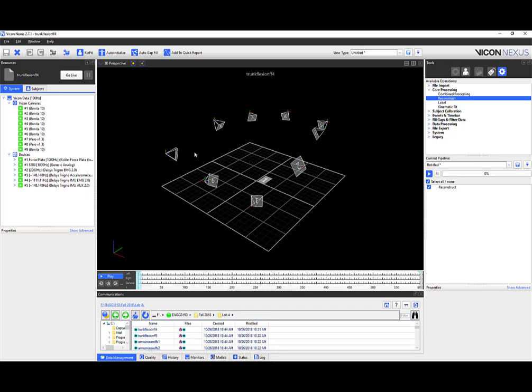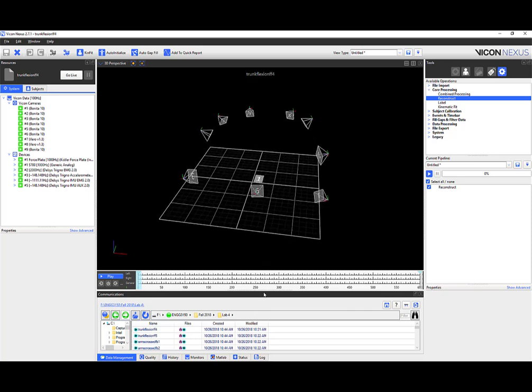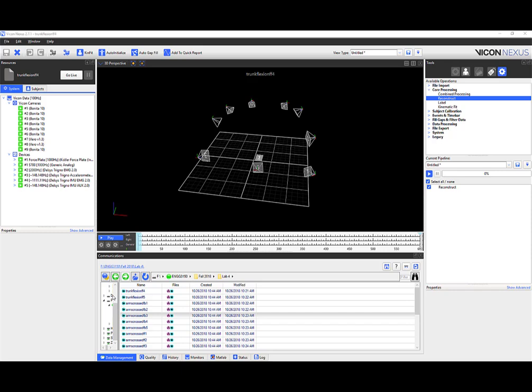So this will be a very casual recording. So I'm just going to be doing my thing here, and just outlining some tips and key points as we go through. So let's say you finish recording, right? This is what you see right here. So I'm going to open up my first trial here. This was one of the labs that we conducted in ENG 3150. So I opened up one of my trials here.